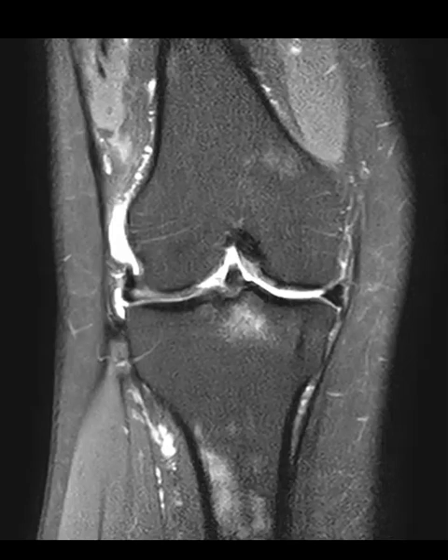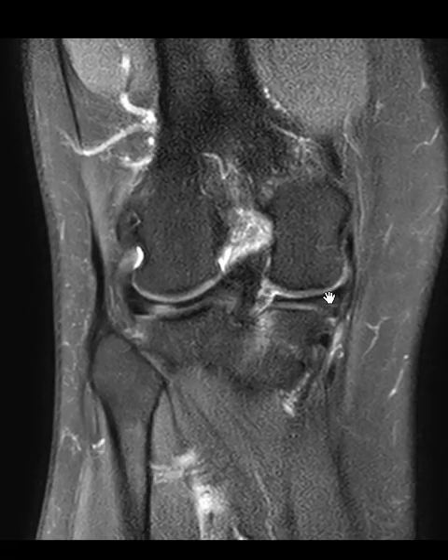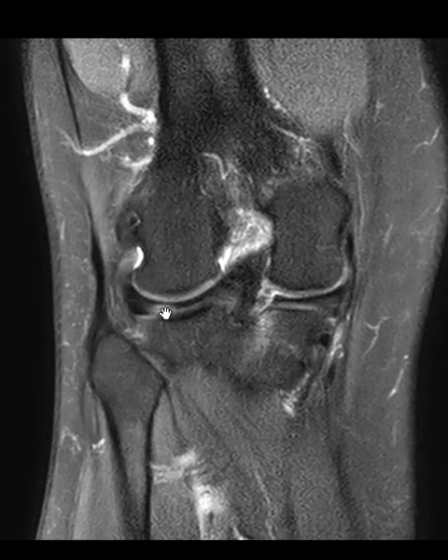Hello, this is Dr. Gay from First Look MRI, and this is a 61-year-old male who complains of knee pain. He has tears of both of his menisci that explain his symptoms. So this is a tear of his medial meniscus root over here. The posterior horn comes across, root tear. He also has an undersurface tear of his lateral meniscus, or undersurface degenerative fraying tear.